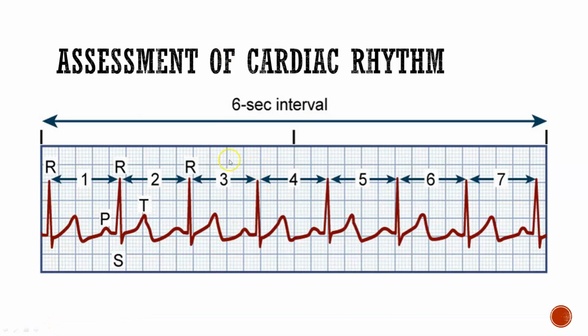Okay, so again, repetition. Here I see an example of everything that I need you to look for. P, QRS. This person does not have a Q, but it's still called the QRS complex. T. And if I were to look at this PQRST, it looks exactly like this PQRST. I'm going to then measure my PRI. Okay. I'm going to measure my QT, and then I'm going to measure my R to Rs.